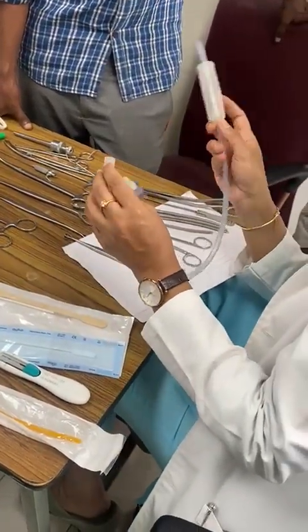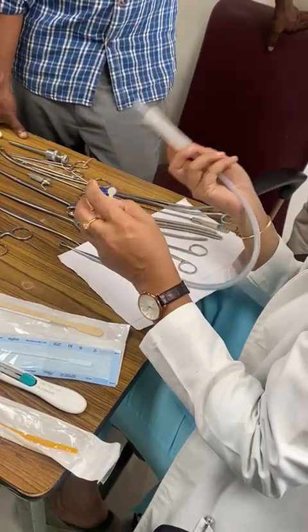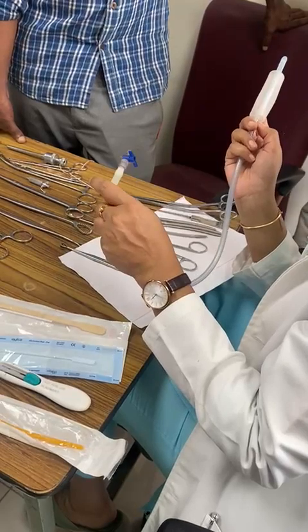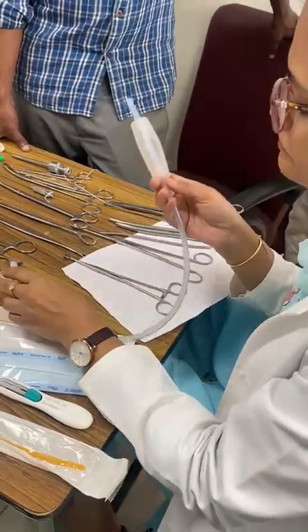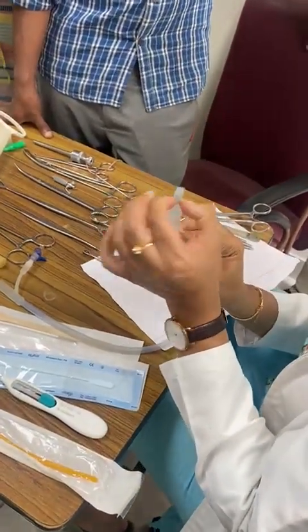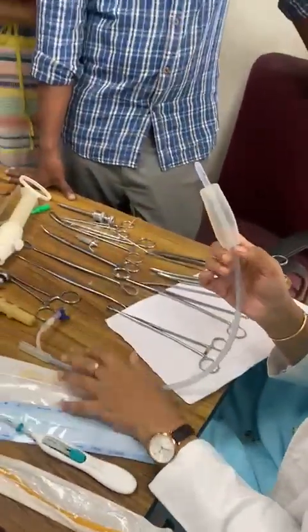They will connect it to an outlet, the same urobag, where you have to measure the amount of blood loss. It has a hole. Can you make it out? Yes, this is where the blood seeps out through the tubing and collects in the bag.